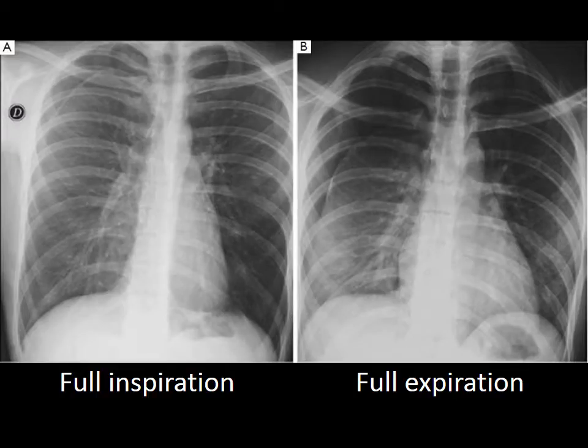If there is diagnostic doubt, a repeat chest X-ray can be performed in full expiration. This makes the pneumothorax easier to see because the lung density increases on expiration.